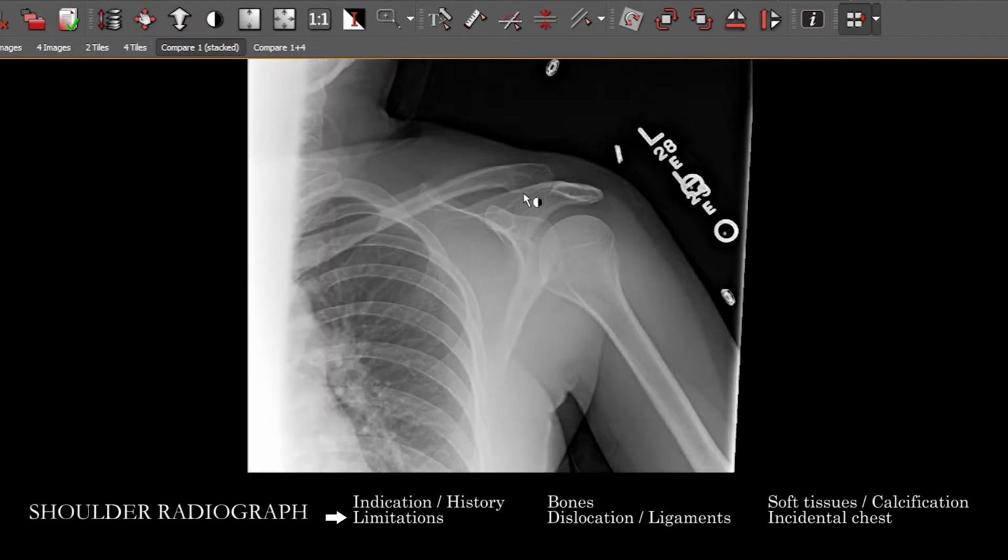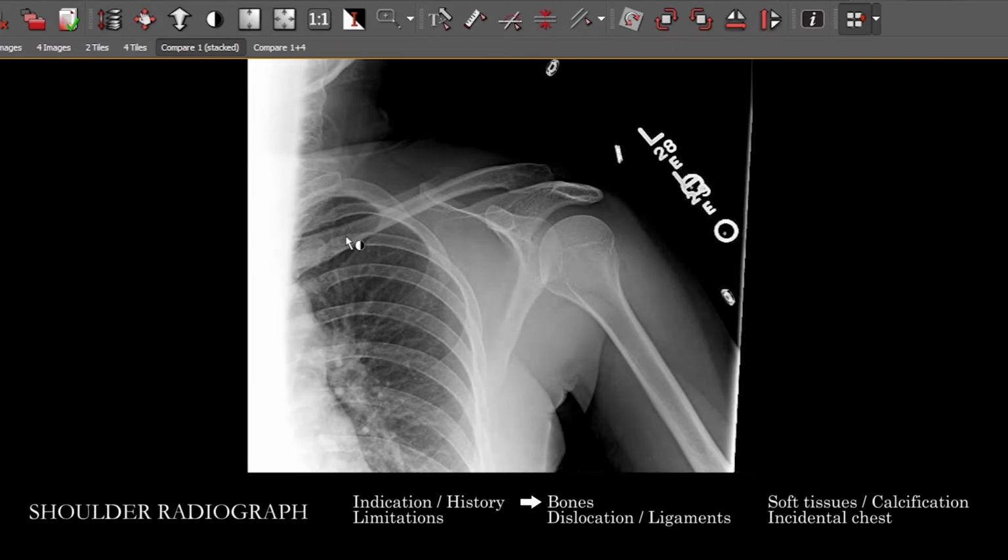But we have here just something pretty standard. So typically what I'll do is window closely and look very carefully at each of the cortices. You have to remember, this is big picture for all skeletal x-rays or any radiographs of osseous structures: fractures don't just appear as abnormal lucency or cortical abnormality. You have to look at the medullary space. You have to look for abnormal calcifications, periosteal reaction, all around, surrounding the bone, at the cortex, where the medullary cavity projects.